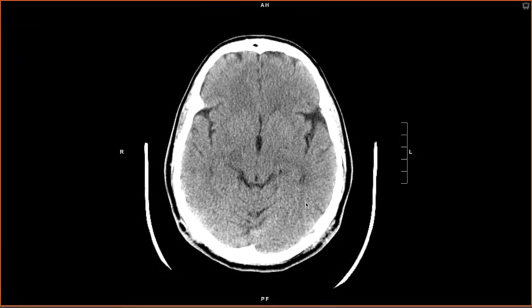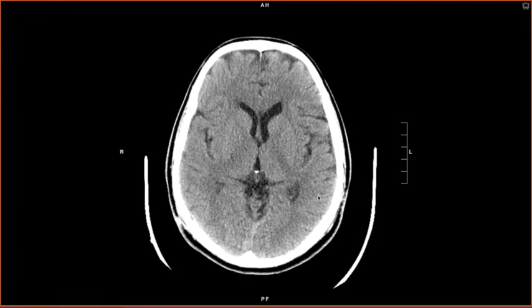Lastly, we talk about the vascular structures you can see on plain CT head. You often look here for signs of acute clot. We already said that acute clot is going to look bright because it is more dense than the other structures in the brain. So a very dense vessel might signify an acute thrombus. First, we discuss the arterial structures. Let's start with the anterior circulation.